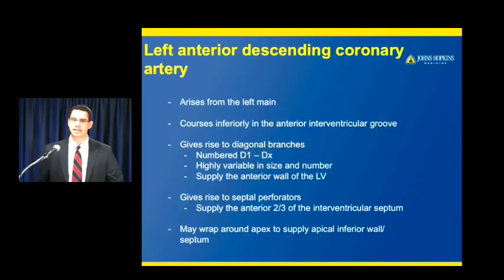So what about the LAD, or the left anterior descending coronary artery? This is the most important coronary artery, really, at least that we worry about generally in the heart. Typically, a lot of the major disease happens here, and this is often the culprit when people have heart attacks.